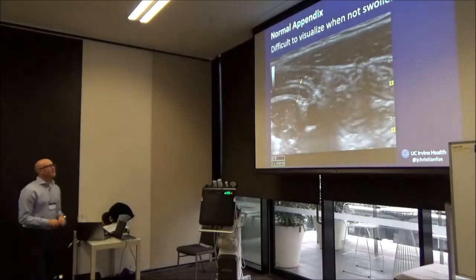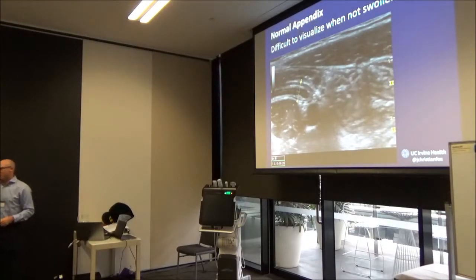So, normal appendix, I know they're hard to find, but you take a medical student and you put them with a healthy model, and then you walk away, give them a half an hour, they'll find it. It's time. This is patience and time, and you can find a normal appendix. It's just that we don't have a half an hour. We're working in the ER. It's impossible.